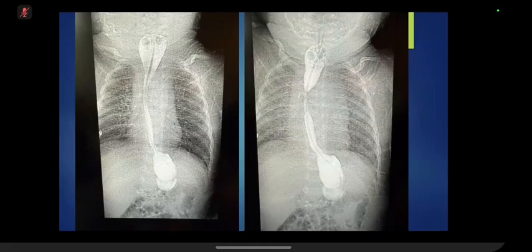So why would the doctor want us to do that? Why not use the NG tube? You also saw maybe the surgical clips. Maybe the baby had a tracheoesophageal fistula. They sent for the imaging to know the success of the management treatment. Very good, you are on the right track.